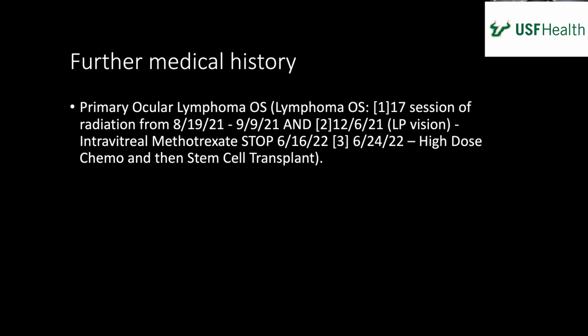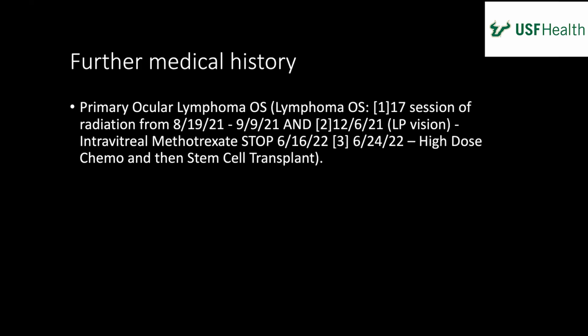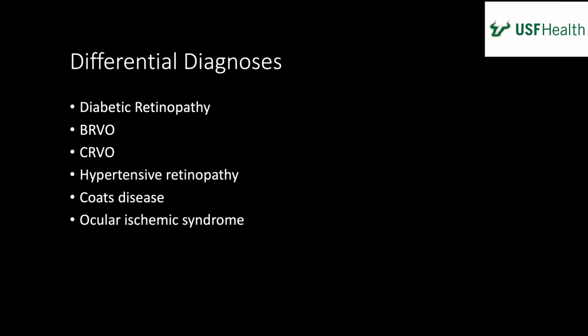So like the radiation retinopathy. Yeah. Nice. We talk about it all the time, but this is one of the best cases I've seen. And it's scattered in his right eye. Yeah, I thought that was interesting too, that he had primary ocular lymphoma of his left eye, and then the more classic findings were in his right eye, and all the research that I've done, the cotton wool spots, the flame hemorrhage. Lymphoma in both eyes at some point. Sorry, that was a mistake on my part. So he did have lymphoma in both at some point. Gotcha. The left eye was a lot worse, but the right eye wasn't wrong, I think.